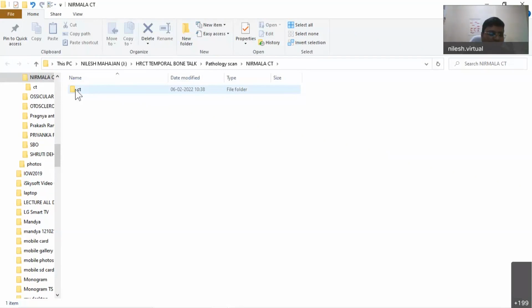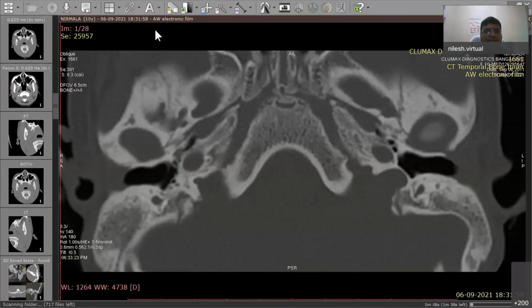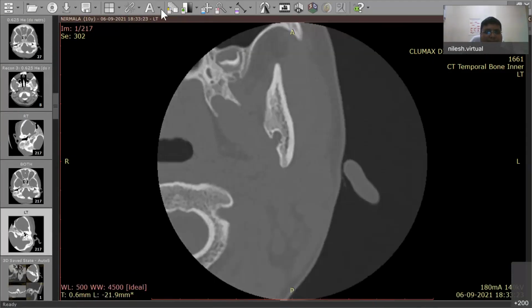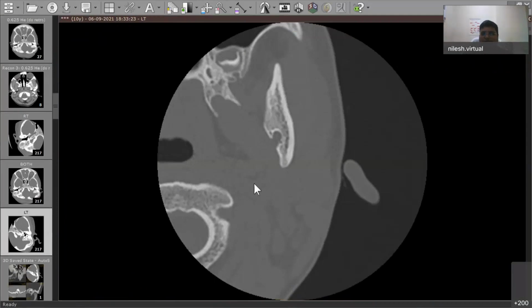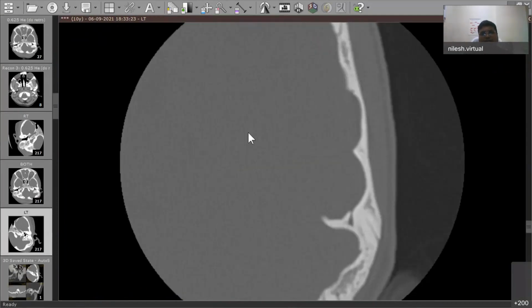So this is the repeat of normal anatomy and radiology of the facial nerve, because many have asked in the chat box to show it once again. Yes, so we'll go to the topmost part. What we are going to find is the internal auditory meatus. How to find it? You have to find the projection from the posterior fossa dura towards the otic capsule.